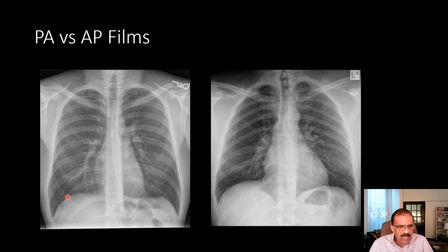So when you come medially, this is the cardiophrenic angle. Again, it is self-explanatory: heart and the diaphragm. This angle is the cardiophrenic angle on the right side. This is the cardiophrenic angle on the left side. Then you can go upward. This is the right cardiac border. The right cardiac border is only slightly lateral to the vertebral column, right? And the left cardiac border is this one.